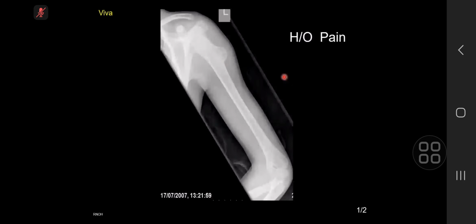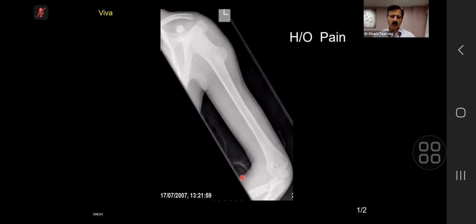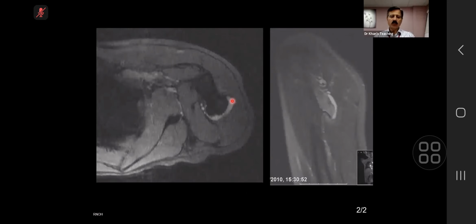So I would compare with any previous radiograph to see if there's any growth or change. There was nothing significant there. Okay, and I would look at both projections to make sure there's no pathological fracture. There was nothing. So my next step will be an MR to evaluate the cartilage cap. Over to you. This is the MR. Of course, you are not on Osirix or a PACS. You cannot measure it, but eyeballing it, what do you think? So it appears to be larger than 2 centimeters.